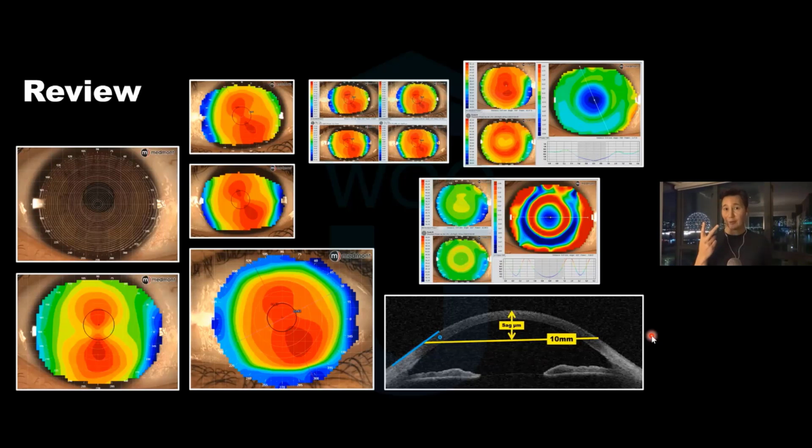Figure out how to do an axial map and a tangential map. And then consider using the topographer with Wave together to build a scleral lens. The platform can build so many lenses, not just Ortho-K, single vision corneal GPs, multifocal GPs, and of course, scleral. So we really have a very valuable tool that goes so much beyond its use in just orthokeratology.